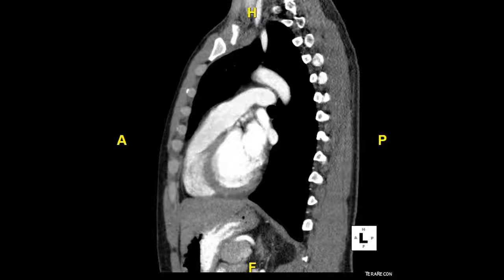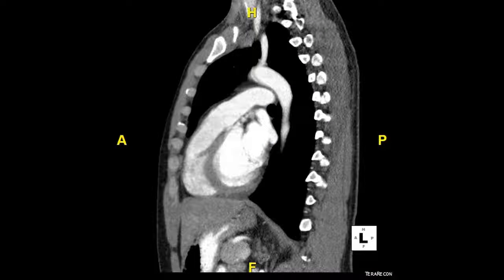Here you can see the two left pulmonary veins starting to become less defined as they reach the left atrium, and I'll circle them both here in light blue. Now let's continue moving even closer to the midline. In these next few images, we will see a lot of the aorta come into view, and we'll orient ourselves once again once we reach an appropriate image.